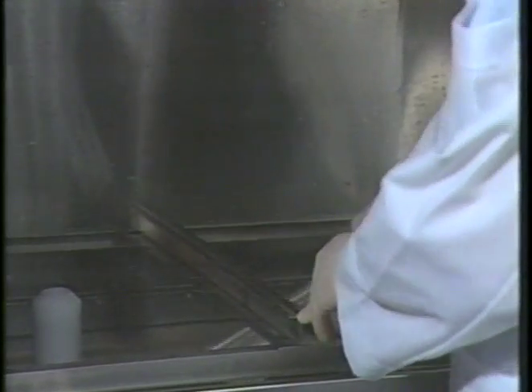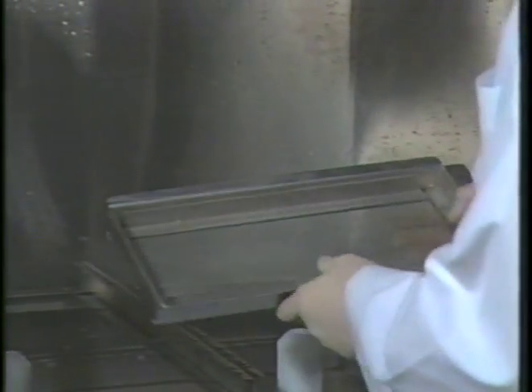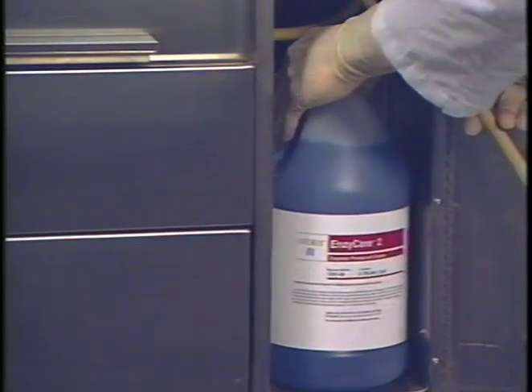It should be the routine duty of personnel in the department to clean the interior of the washer on a timely basis to remove any residue or scaling caused by the washing process. Spray arm and manifold nozzles should be checked for clearance and clogging. All filter screens should be removed and cleaned daily. Detergent levels should be monitored. The exterior cabinet should be cleaned as needed. If the system has an alarm, all lights and sounding mechanisms must be checked regularly.